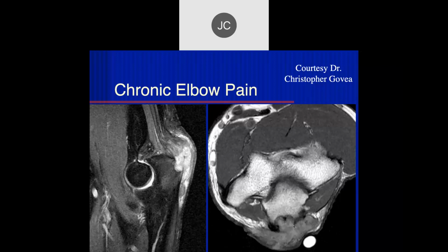Almost every other disease, when you get an erosion of the bone, all these potentially sharp angles get smoothed out. And you can see a nice sharp little spicule of bone here. With gout, it just loves to have these little margins of sharp spicules of bone. So when you see that, you've got to be very concerned about gout. And we'll see it in other joints, especially when we get into the feet as well. So this was gout.